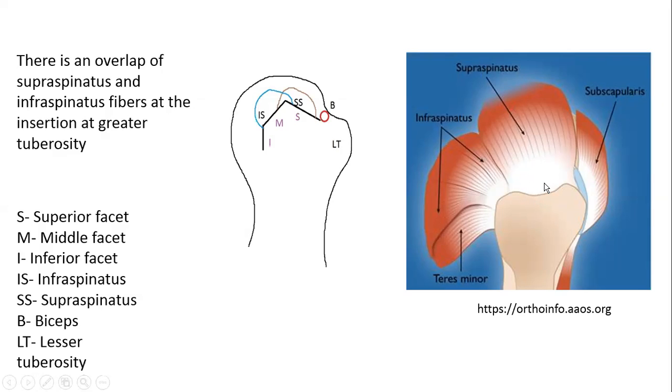Yeah, this tear is confusing, especially the terminology, because full thickness sounds like something really bad, but this is not that bad because there are still some fibers intact on the other portion of the tendon. Make sense or not? Can you explain the difference again? Focal full thickness and just full thickness. So one is a full thickness complete tear. So nothing from here to here is attached. This entire thing is torn and retracted medially. So that's full thickness complete.